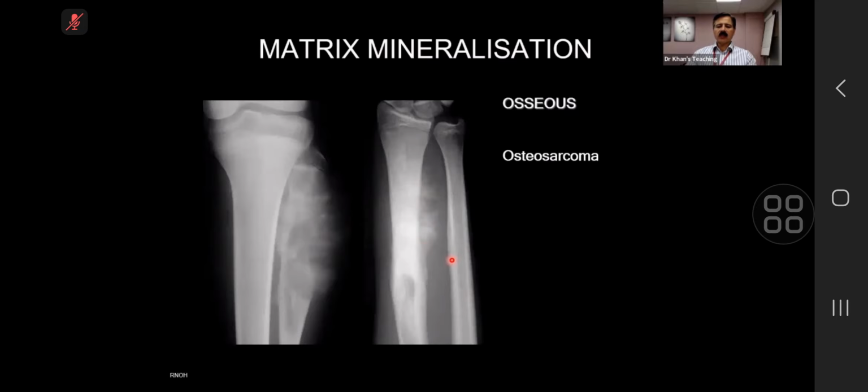In the conclusion you say that because this is osseous, this is a bone forming tumor, and this is in keeping with an osteosarcoma. So the examiner will ask you what the differential is, and you can say that I did consider Ewing sarcoma in this age group, which is not an adult. However, this osseous matrix goes against that. So I'll stick with osteosarcoma.